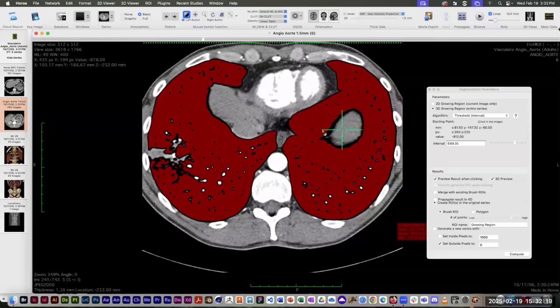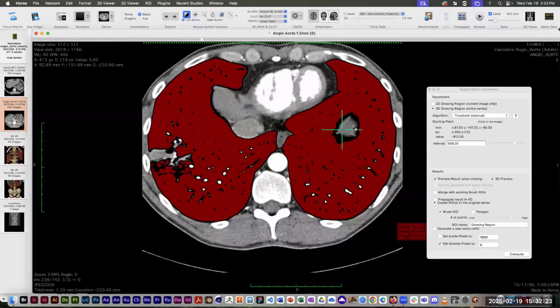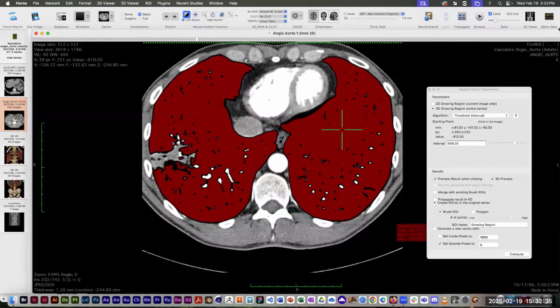And even this little oval gap here, that's just, again, because of the dome of the diaphragm. This particular person actually has a tumor of their right lung, which you can see over here on the left. So there's this noticeable gap in the lung over here. I'm just going to leave that and we'll just export that as part of the model, but it's going to create like a noticeable chunk missing out of our 3D model.